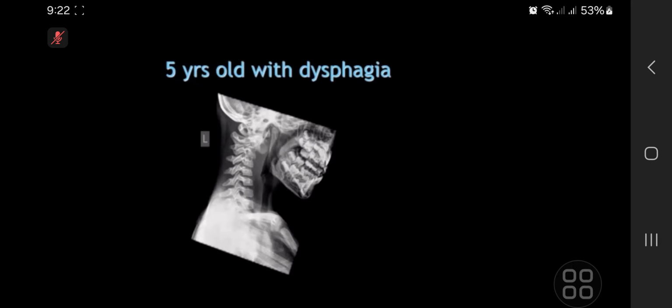So the straightening of the cervical spine and looking at the pre-vertebral space, specifically at the upper cervical region. There's widening of the region, and also I can see there's impressions of a rounded, well-defined opacity just anterior to, at the level of C2.